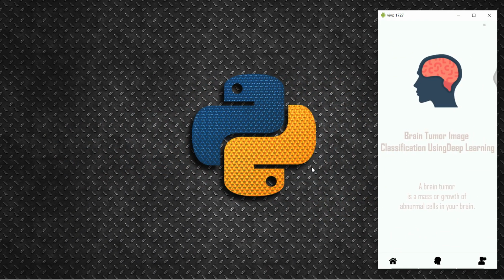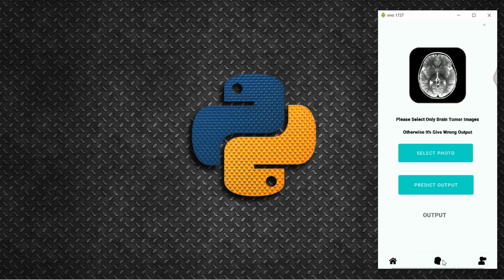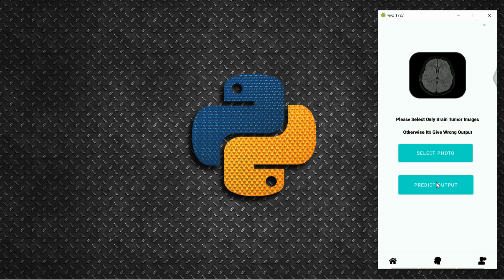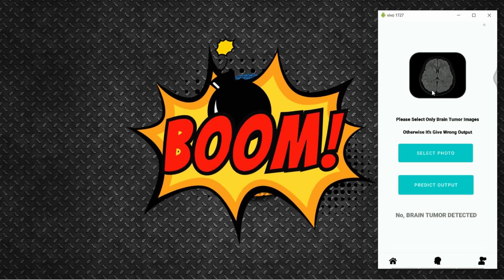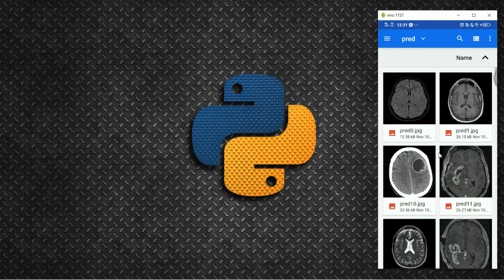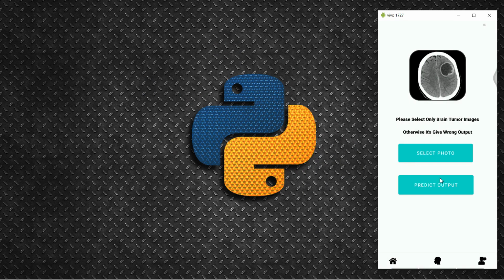As you can see here, this is the demo application, brain tumor image classification using deep learning. This is nothing but the home page. If I click here on detection, you can see the page opens. If I click here to select a photo, let's choose this one and click predict output. As you can see, this is no brain tumor. If I click select photo again, choose this one, and predict output, you can see, yes, brain tumor detected.